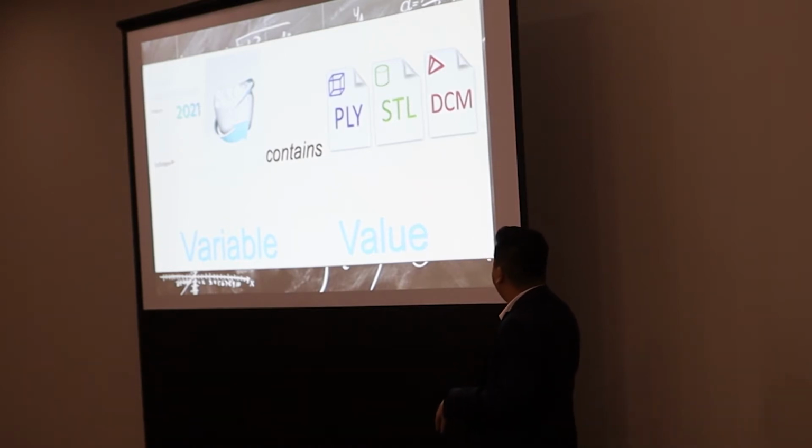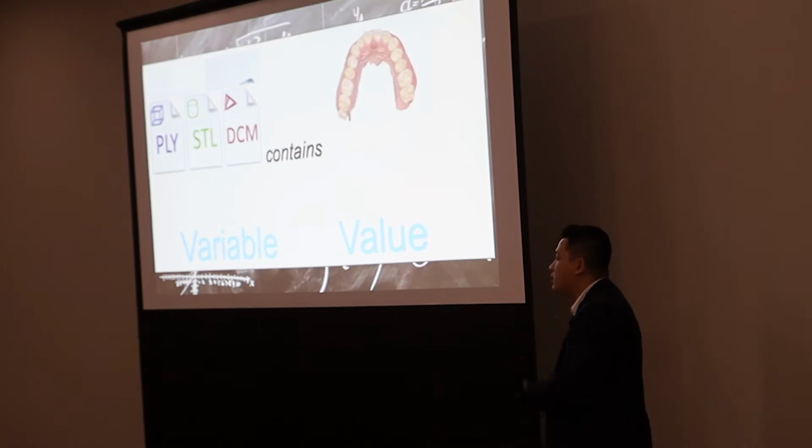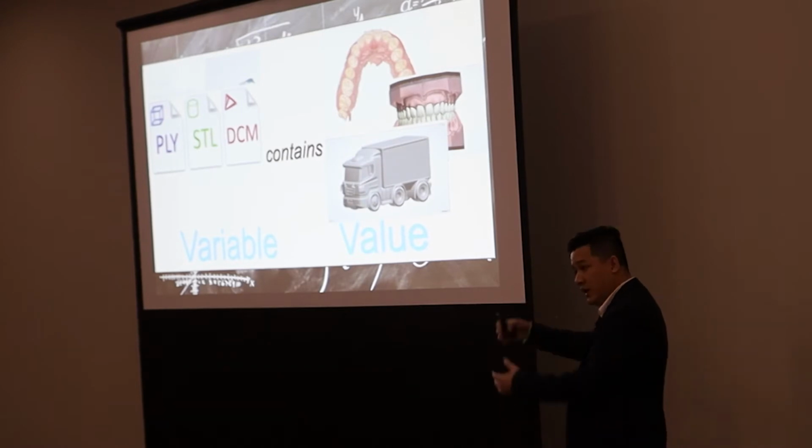But we can also look at all these sub-items, so a DCM file is also a variable. It's also a container. And inside of that DCM, you have either a tooth, a full arch maxillary scan, you can have complete dentures inside that DCM, or you can even put a truck inside of that DCM.